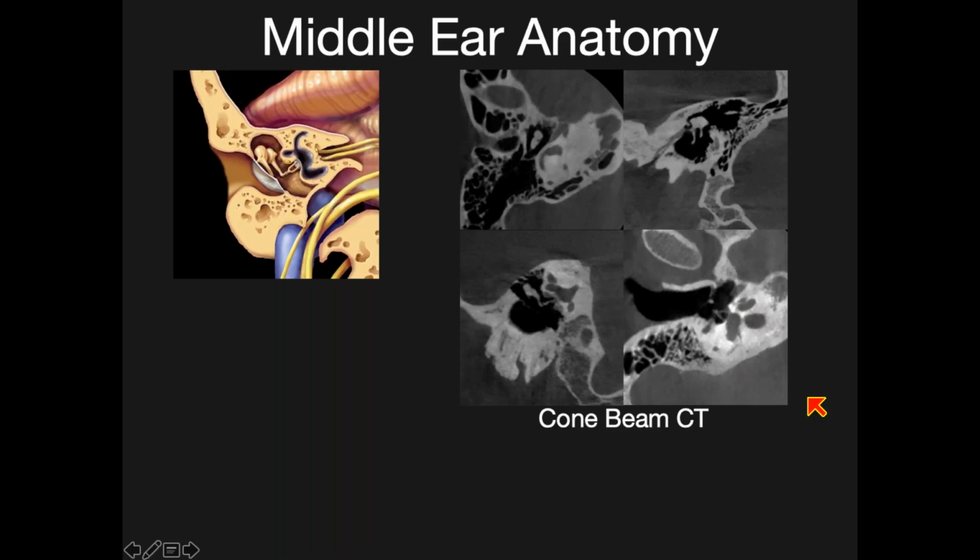We've been very fortunate to have cone beam CT in Leicester for the last couple of years. Cone beam CT is very similar to the regular CT in terms of using radiation. The way the images are acquired are slightly different. What it allows us is to look at bone and details, particularly of dental, sinus, and temporal bone structures very well. And this is a normal patient.